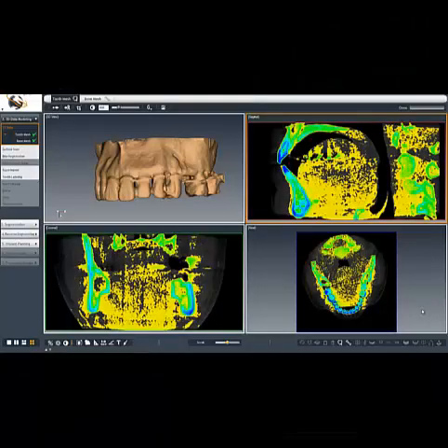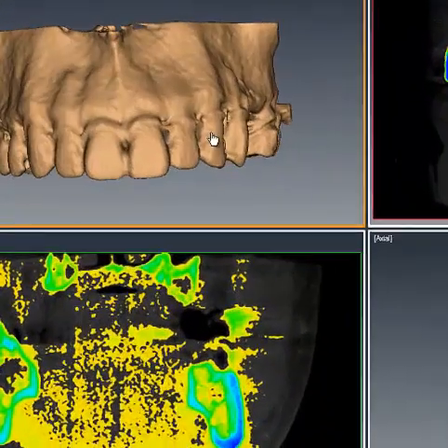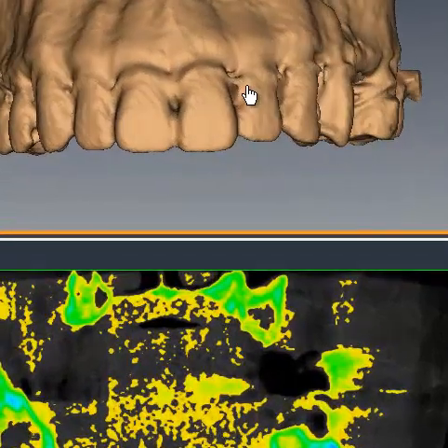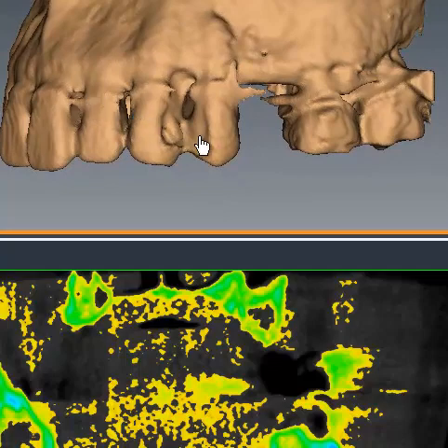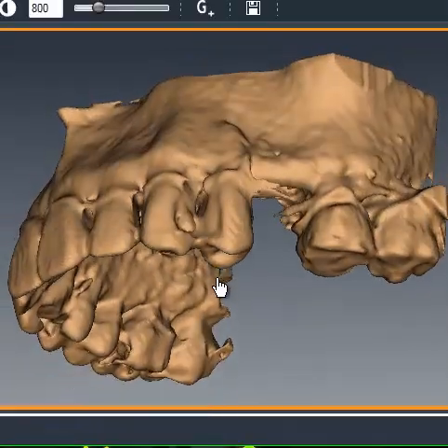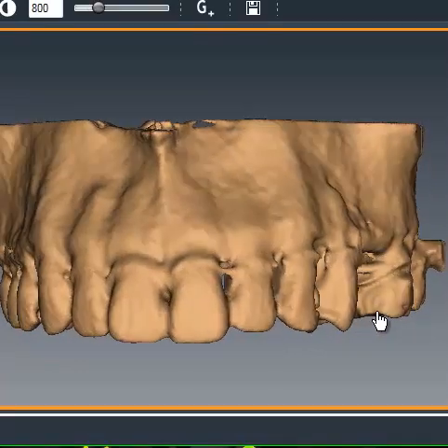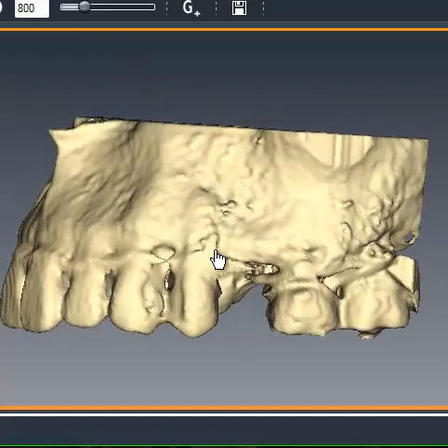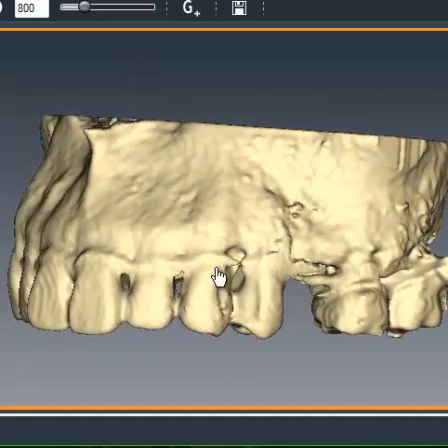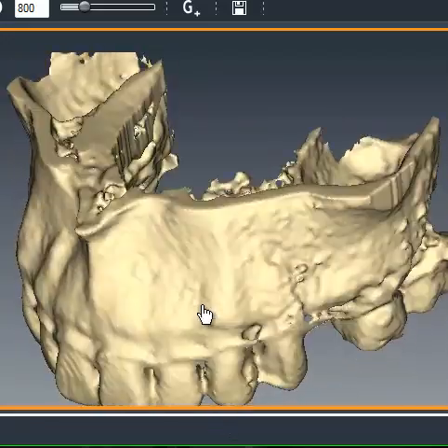This is a treatment plan for a single unit post-extraction upper second bicuspid, tooth number 13. After rendering the DICOMs and rendering the bone mesh and the tooth mesh right here and cleaning up all the scatter, we were able to take a closer look at the visual position of tooth number 13. There looks like there's plenty of bone there for the implant placement. Again, looking at the bone view with the cleanup of the scatter that is available, we can see that there's plenty of bone height away from the maxillary sinus on that side.